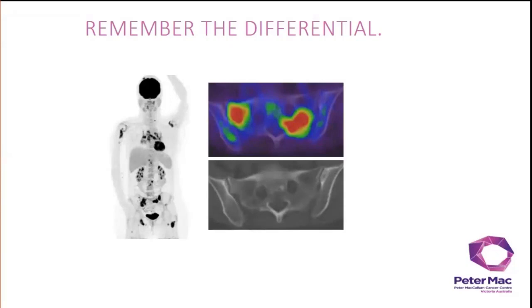So many points of interest in this case. Firstly, almost all the findings were occult on CT, which provided difficulties for biopsy targeting as we had to use anatomical landmarks only. Also, you'll note that there are relatively symmetric avid nodes in the mediastinum that certainly could raise the possibility of a more widespread granulomatous process, but certainly does not prove that the bony lesions are part of the same process.